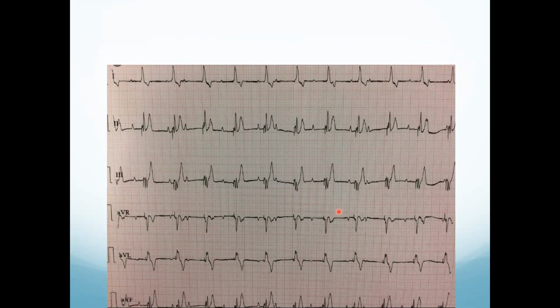Another thing you might see in an ER setting is a patient who's already had a pacemaker, and maybe the owners are in tune with things and bring them in because they're worried because the pacemaker is not functioning properly. And so with paced ventricular rhythms, again, we're not going to see association between the P waves and the QRS complexes. Okay? So the P waves are happening at all different intervals. So we've got two independent rhythms marching along one another.